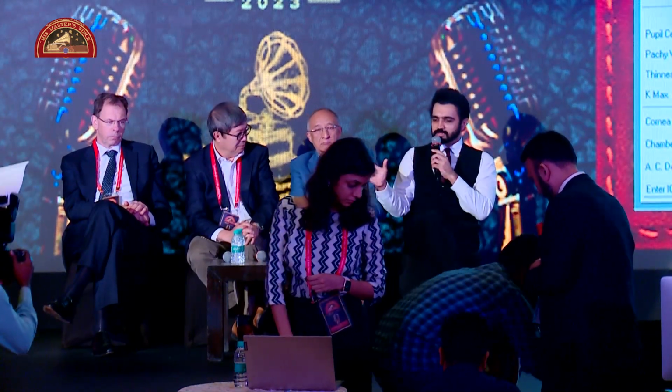So the whole point, I think what Dr. Ron was mentioning was, most of us do have not just one, we have at least 2 or 3, or many. And we're looking at the scans, all K values are different, and the axis is different. Not very significantly different, but there is some amount of difference between the 3. And you really don't know which one to choose for a toric IOL.